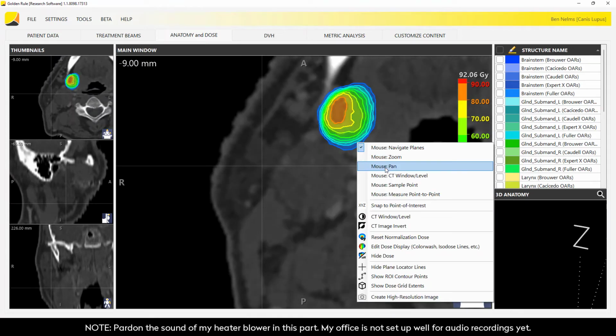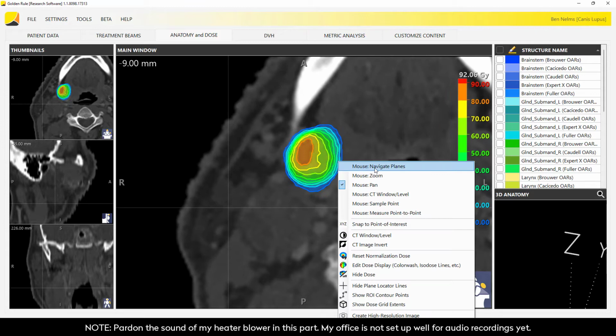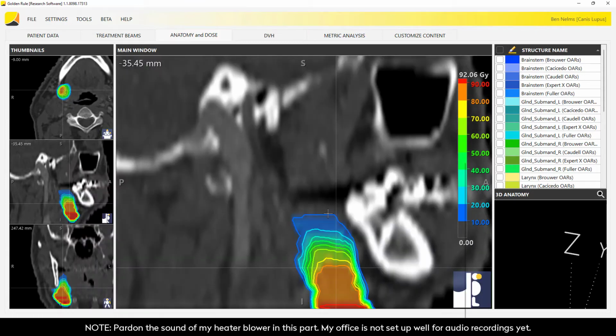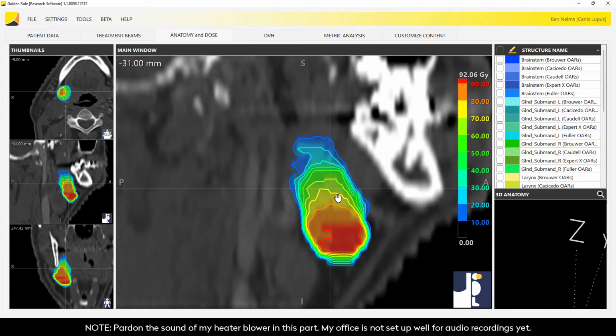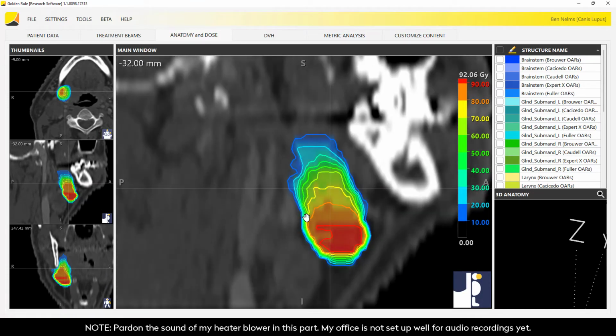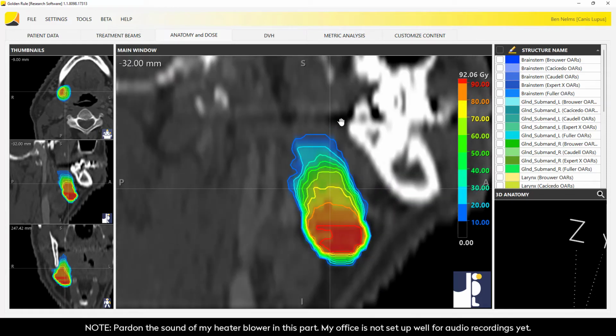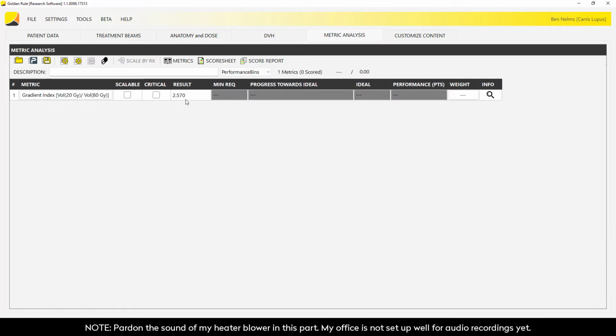All right, let's go find this. Oh, now this is interesting. If we look at the sagittal view here, let's examine qualitatively. Good agreement here on these edges, the inferior edge, and everyone agreed on this small volume, but then there started to be a lot of disagreement on how far up the right submandibular gland goes.